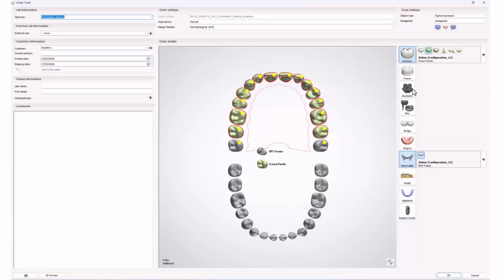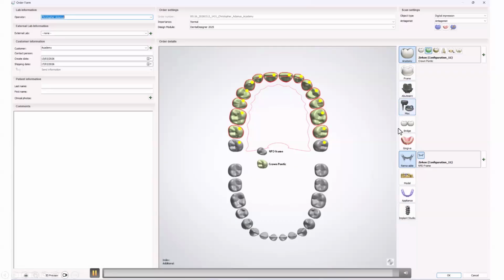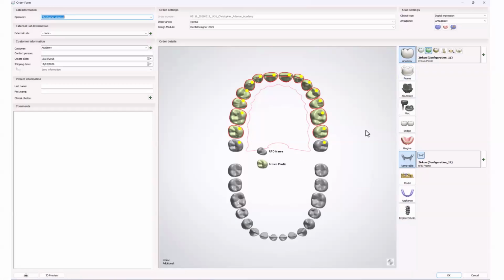Obviously, if we're going to be using pontics with an intention of fitting it with a composite, then we can use major connector without giving it too much of a shaping, and use the pontics as basically a substructure for the final restoration. In here, I will leave it up to you which option will work, but that would be the main differences in here.